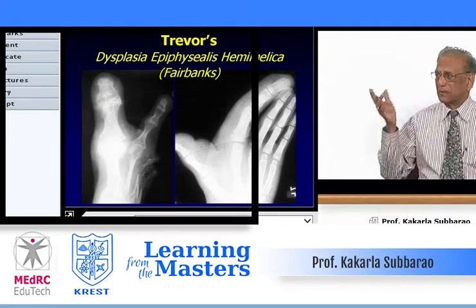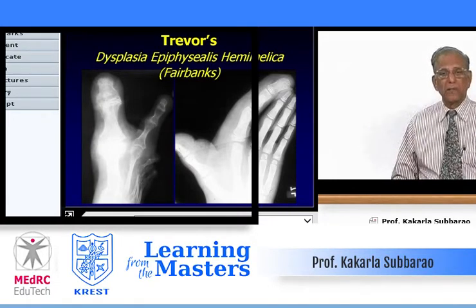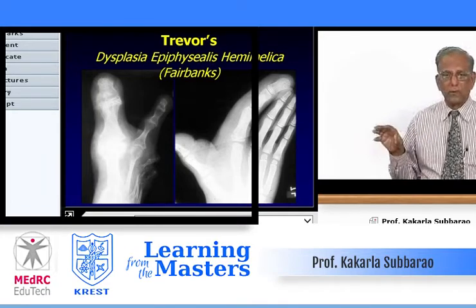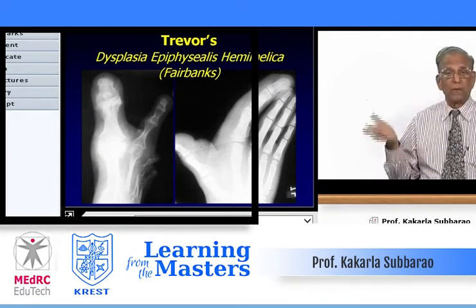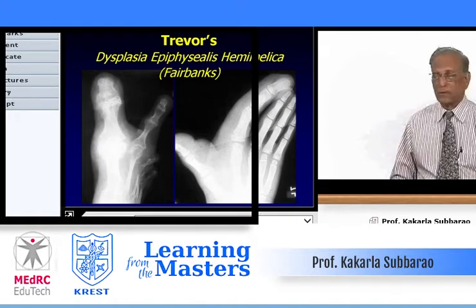And then the one on your left side, namely the great toe, is in the case of neurofibromatosis. There may be generalized neurofibromatosis, but this is a particular localized neurofibromatosis, because of the hyperemia, the bones get bigger. Because it is a developmental change, they grow into enormous proportions until the growth ceases.